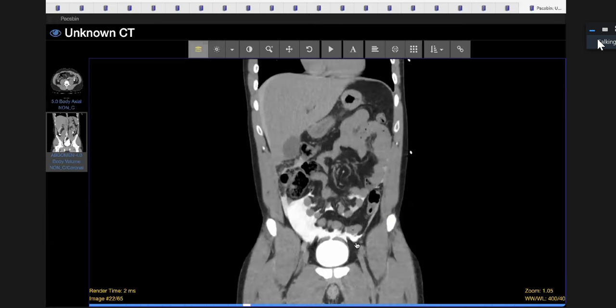It's been kicked or punched in the abdomen with a full bladder, and that's caused a rupture at the top of the bladder, and then the urine is just leaking into the abdomen, and this can lead to chemical peritonitis. So the pelvic fracture is not so relevant for this particular type of rupture. But anyway, there you go.